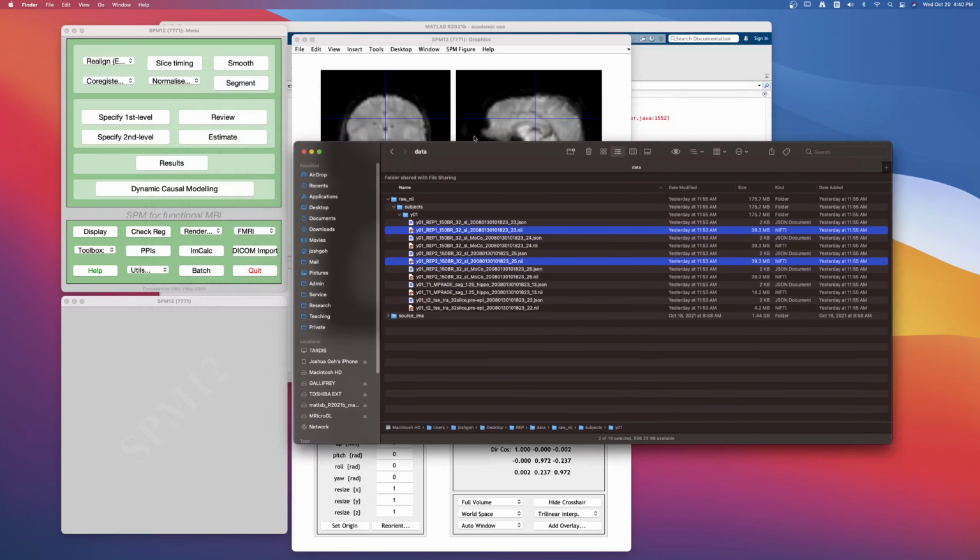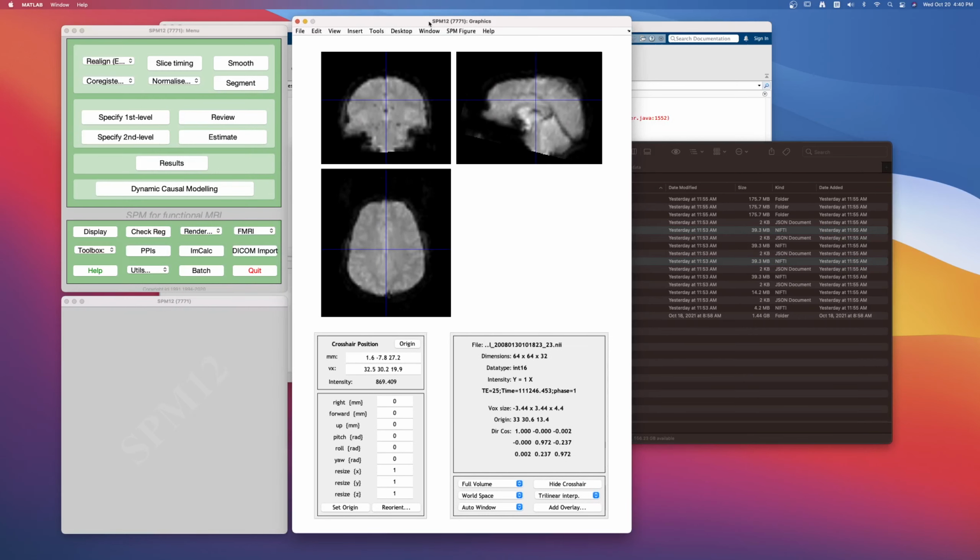All right. So first of all, it's helpful to take a look and to see the motion that might be present in the data visually. You don't have to do this all the time, but I'm just going to show you how to do it using the Check Reg function first. And I demonstrated this in class before, but here it is again for us to see the motion that might be present, let's say, in Rep 1 for Y01.